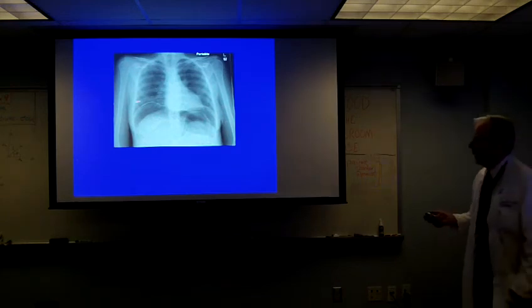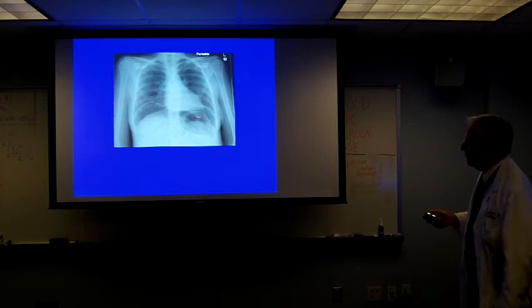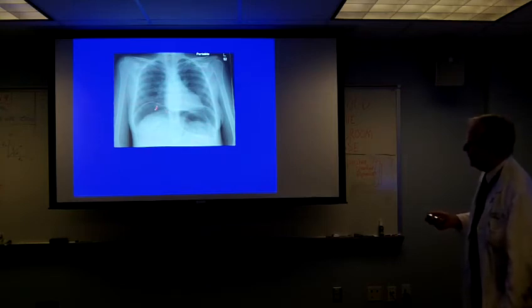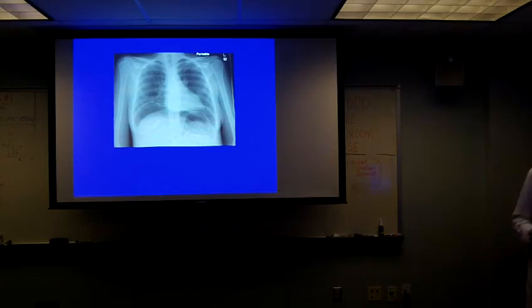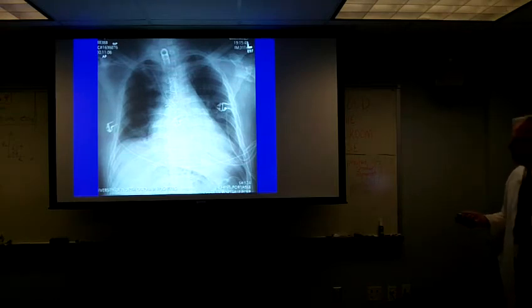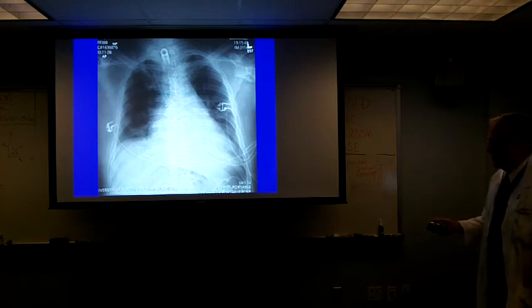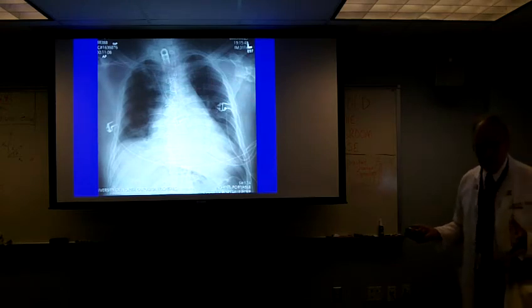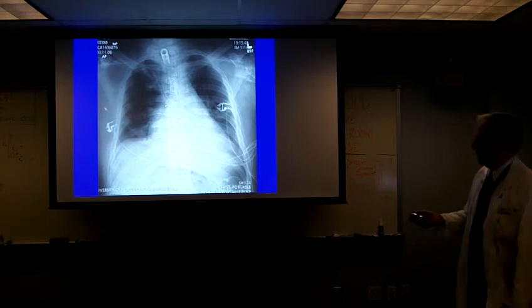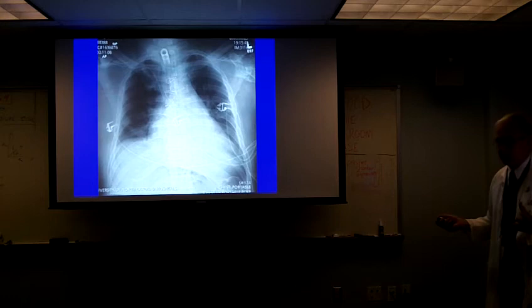Here's a patient who's got obvious free air. This is semi-erect, and you can see air outlining the gas-filled stomach and over the liver margin. Not quite so obvious on this case, but there's too much lucency down here. Your clue is generally that the density in the left upper quadrant and the density in the right upper quadrant should be about the same. If they're different and the soft tissue density on the chest wall is the same, then there's air there.